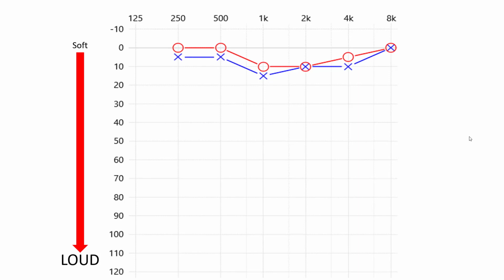You can see that the scale extends to -10. It allows for negative numbers. How could you hear better than 0 decibels? Well, it's a relative scale. We're measuring an amount of energy relative to another amount of energy. And so if you hear better than a normal average adult, you might have a hearing level which is in the negative side of that scale.